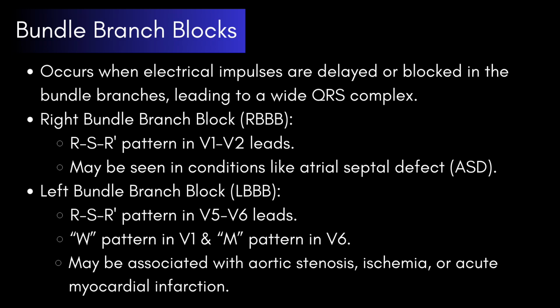In a left bundle branch block, an RSR pattern can be observed in the V5 to V6 leads. A W pattern in V1 and M pattern in V6 can also be observed. It also may be associated with aortic stenosis, ischemia, or acute myocardial infarction.